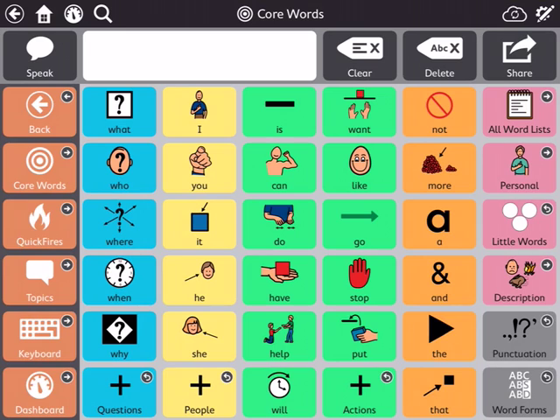So I'll just go into it a little bit. You can also just change the grid size, which I'll show you in a little bit, but you push buttons to be able to talk, but you can formulate your sentence first, or it can talk on command as you type in the words. It's just a setting change that you do. So let's do this one.